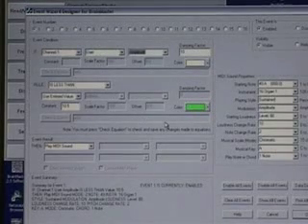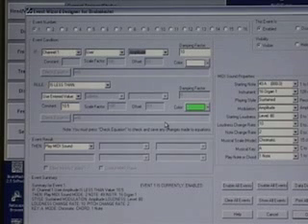But it is also an advanced feature in Brainmaster? Absolutely. It adds to all of the existing training capabilities. None of the old capabilities are gone. They all remain. And the Event Wizard rides on top of them and adds entirely new capabilities.